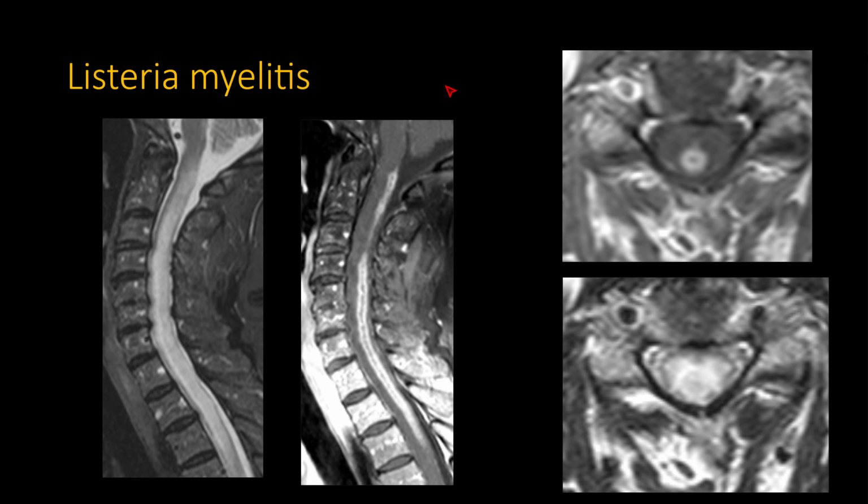So, shifting gears into other causes of transverse myelitis, obviously, cases of transverse myelitis always require exclusion of infectious etiologies. Unlike the partial transverse myelitis, where true infectious causes are rare or not really measurable in the series, in transverse myelitis, infectious causes should always be excluded because that's what they would present with. So I have here a case of listeria or presumed listeria myelitis.